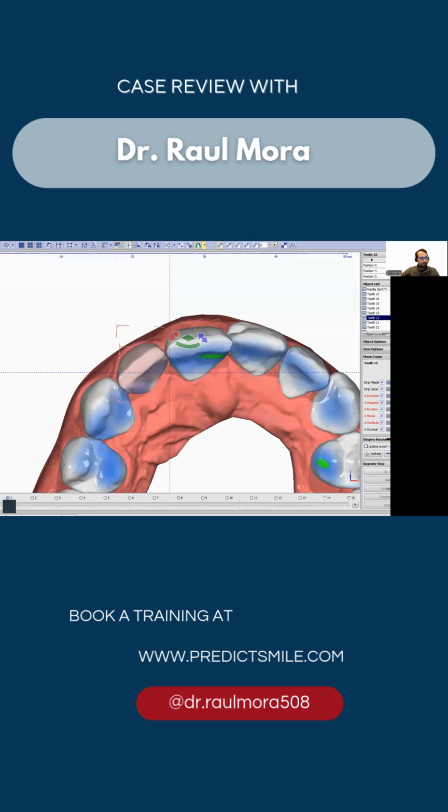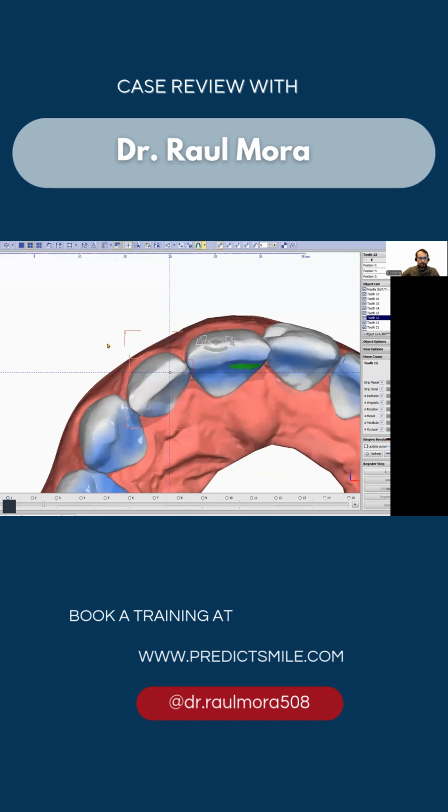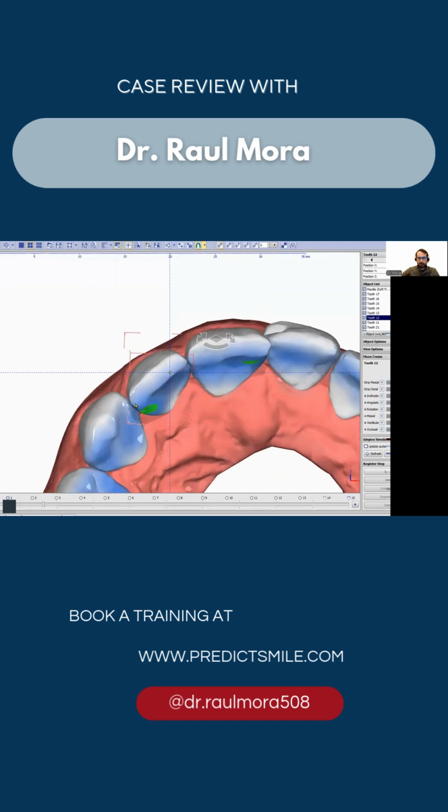And let me just stretch this movement out in the staging panel. And one second. So now we're going to have this movement from the very beginning. You can see the distal out. We may have some collisions here, so we're going to make some round tripping with the canine. Move forward a little bit to let this lateral incisor move freely.